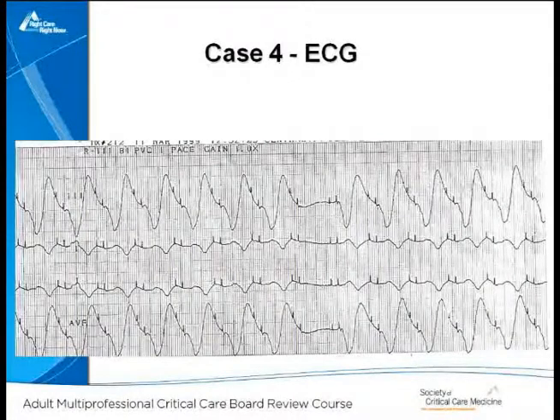And you also will note, if you look at it, that there seems to be some delay between the onset of the pacing spike and the start of the QRS. It looks particularly prominent here, but even up here, you see that the pacing spike doesn't have a sharp takeoff. When you see that, you should think something is poisoning the heart. And it can be seen with drugs, so this could be somebody with drug toxicity. The other thing is hyperkalemia.